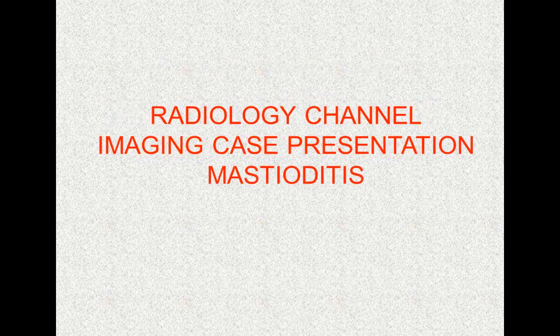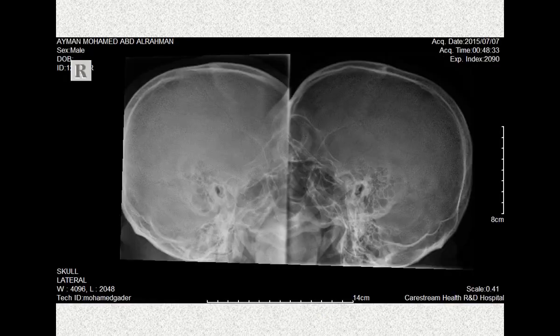Imaging case presentation of mastoiditis in plain X-ray. This case presented with a mastoid view for report. Maybe you find it easy to diagnose glioma or cervical disc herniation, but it is difficult to diagnose mastoiditis on plain X-ray. We are not familiar with it, we are not interested in it. We look for it as it is a small subject.